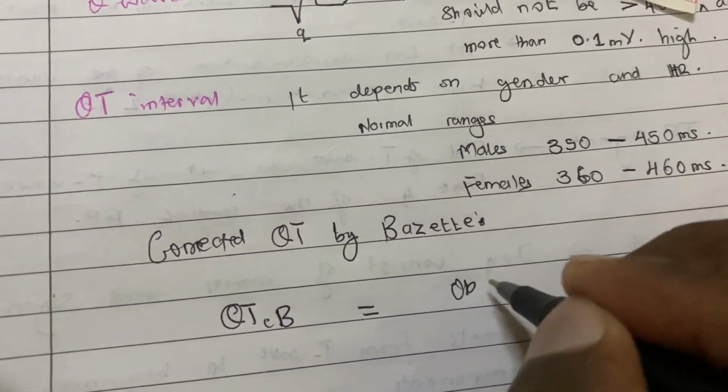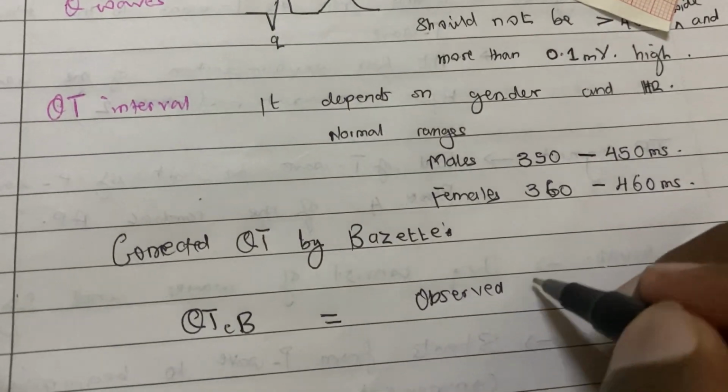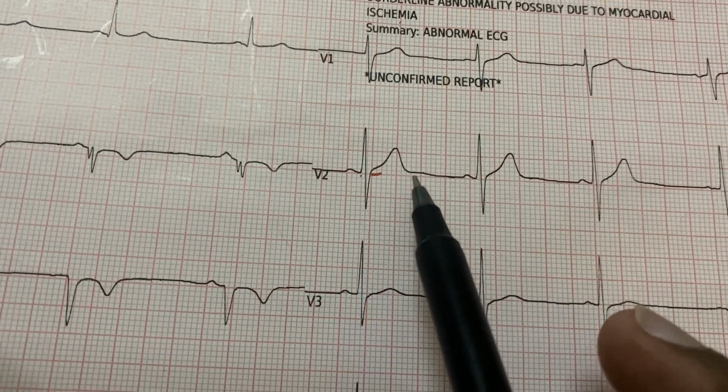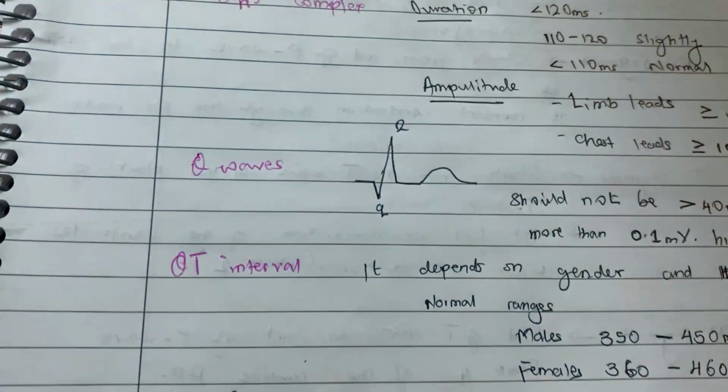We have the observed QT. What is the observed QT? The one you can measure from here. Like from here to here, that is the QT, and how much is it? That is the observed.